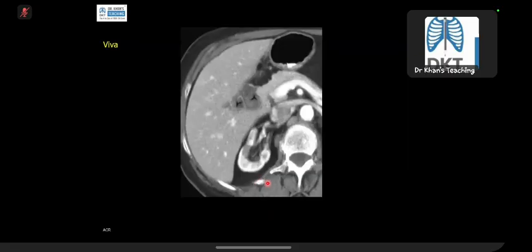Yes, what is this? So post-surgical, right? Iatrogenic stricture. This is the classical location. They have damaged it, and later fibrosis developed. The surgeons don't agree, they say they cannot do this. No way. And why is this chronic pancreatitis? If you see, there is calcification, and you will see tapering of the stricture. So this is chronic pancreatitis.